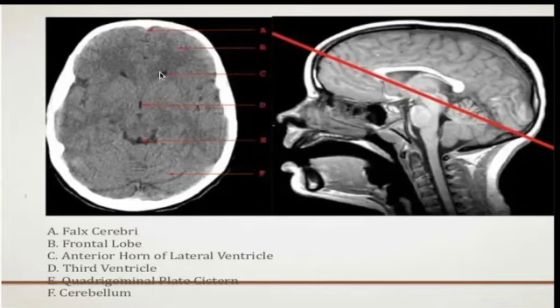Now because this isn't parenchyma, it should be gray. It's not bone, so it shouldn't be white. It's not air, so it's not pitch black. However, water still has a low density, which is why it should appear darker than its surroundings. So whenever you're looking at these darker points within the brain parenchyma, you should suspect something that is filled with fluid. Now, if you know your anatomy, normally at this level you should be looking at the anterior horns of the lateral ventricle.